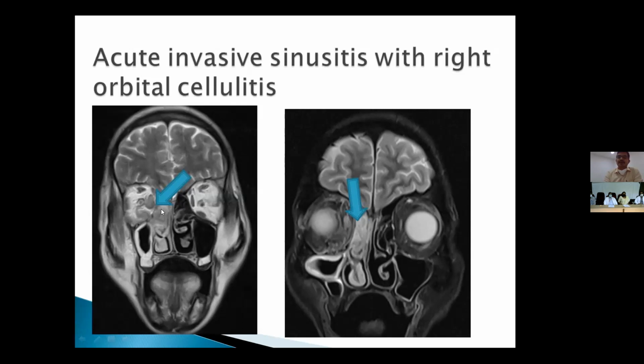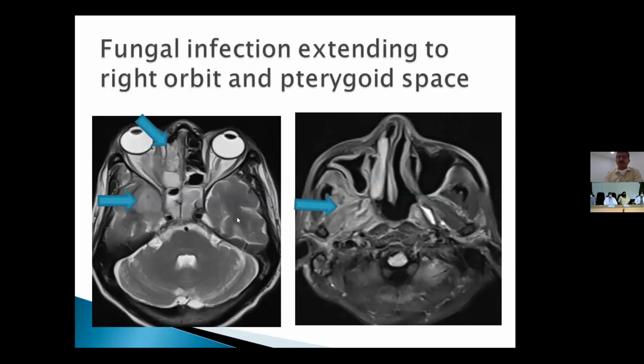Though here we can see the hypointense signals. In the right maxillary sinus, we are seeing normal hyperintense mucosal thickening, which means that disease has not spread into the maxillary sinus cavity. Also present in the patient are hyperintense signals occupying the entire pterygoid and masticator space. So there is extra sinus invasion into the pterygoid space.